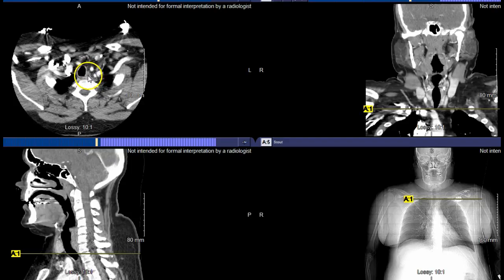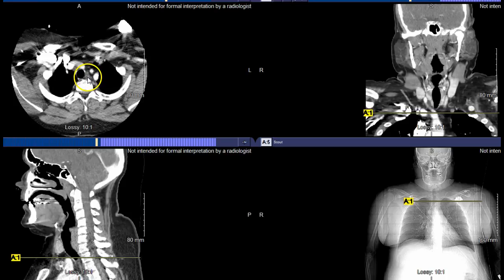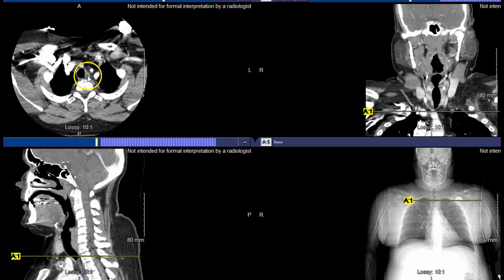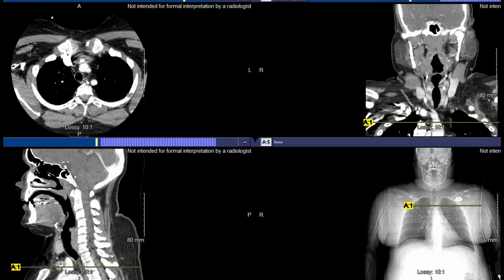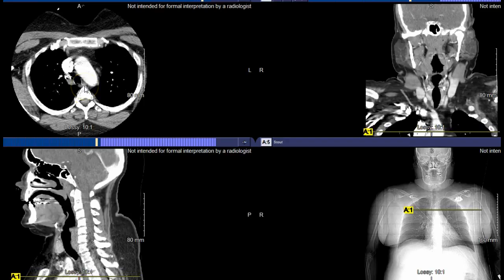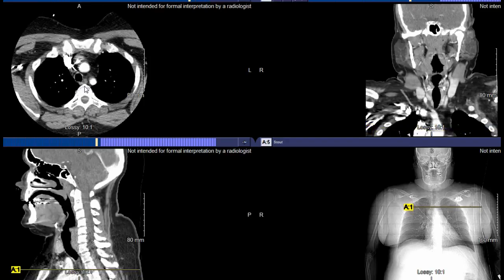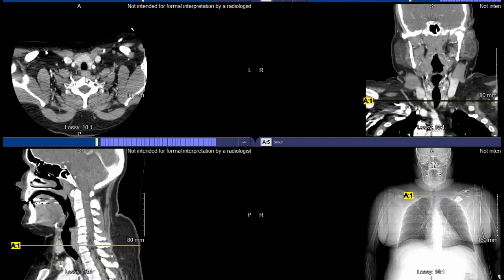I'm just going to leave my mouse pointer all over the esophagus, and you can see a little bit of air housed right in there. But continuing to go down, you can see that those structures are indeed in different locations than one might think. So as we continue to go back up now, let's reiterate some of those other structures that I want you to know.